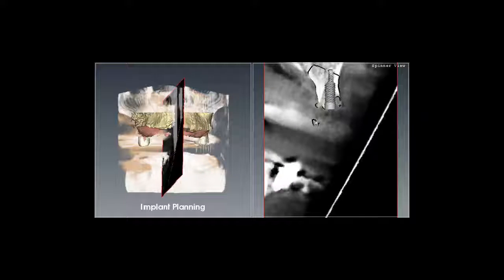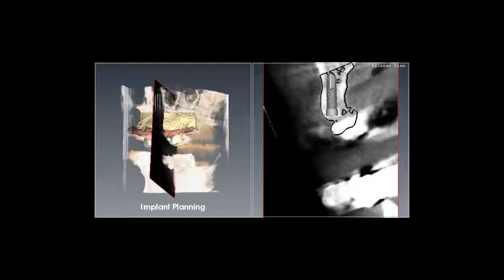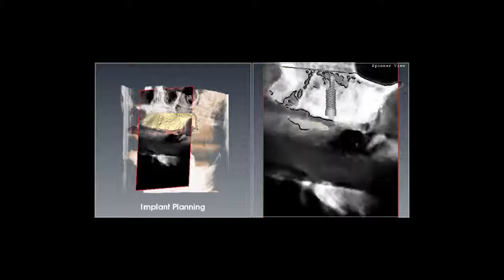Again, there's plenty of bone on number 8, maybe a little bit of augmentation on the buccal plate there to make sure we have enough bone as you load anteriorly. Then number 9 is going to go in, plenty of room on number 9. We chose number 9 because it's good. And then of course the last implant is the number 13 implant in this case. This should conclude the treatment plan for this full upper reconstruction.